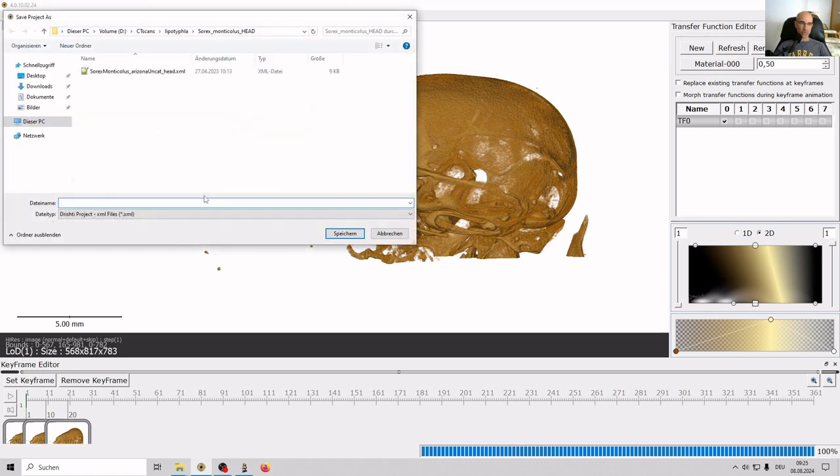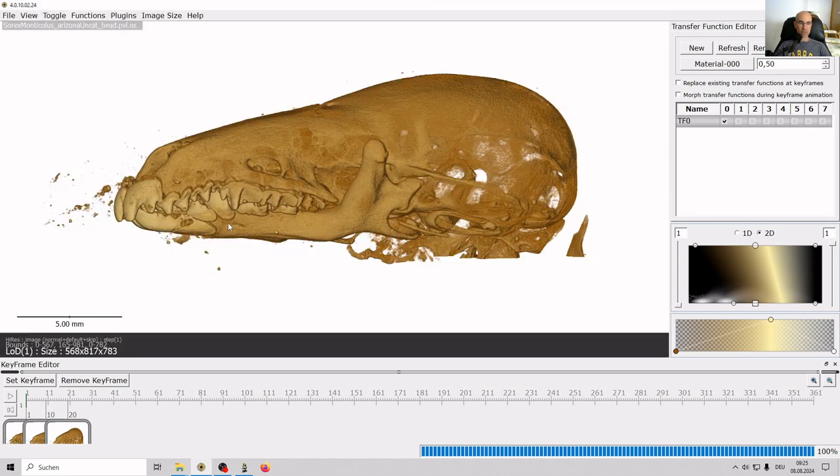So we'll click on Save As, left click, and then we're just going to call this movie 1, and it'll save it as an XML so that, for obvious reasons, if it does crash, you can always come back and you'll have these 3 keyframes, or whatever it was that you've saved, ready to go again.